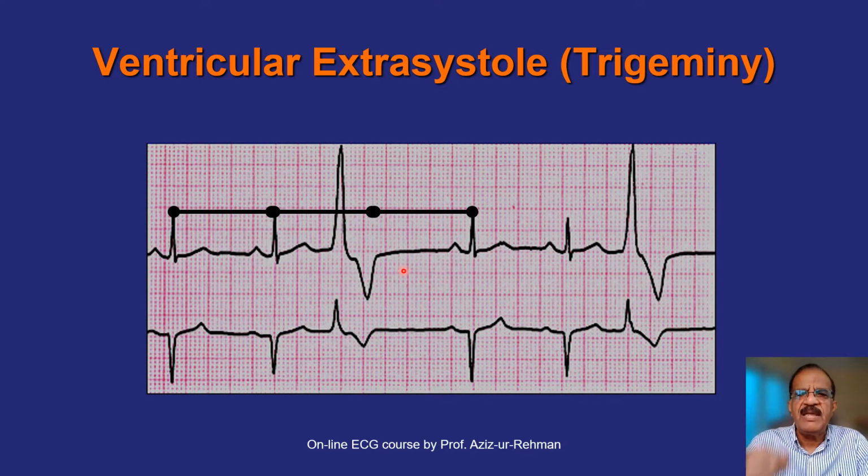The actual explanation is that since for the atria nothing happened, the atrial depolarization and the ventricular depolarization resulting from the sinus beat would come at its expected time. So this extra time will fully compensate this short time. This is what is meant by full compensation.